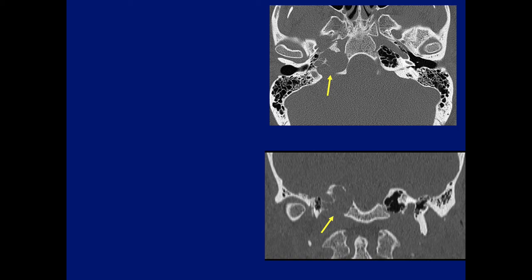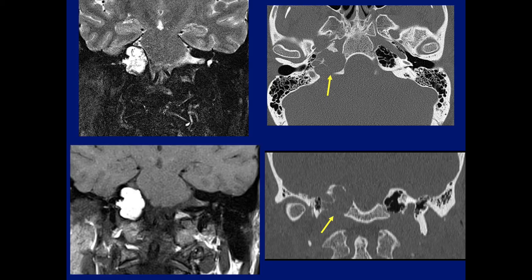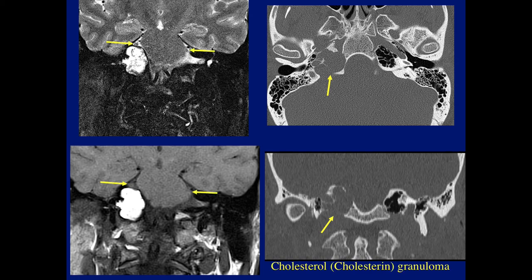Very good. Everybody, Gino, Nate, and Eric mention possibilities, but I have to say that Gino came up with the right answer. This was a very destructive lesion arising from the temporal bone. This was a cholesterol granuloma.